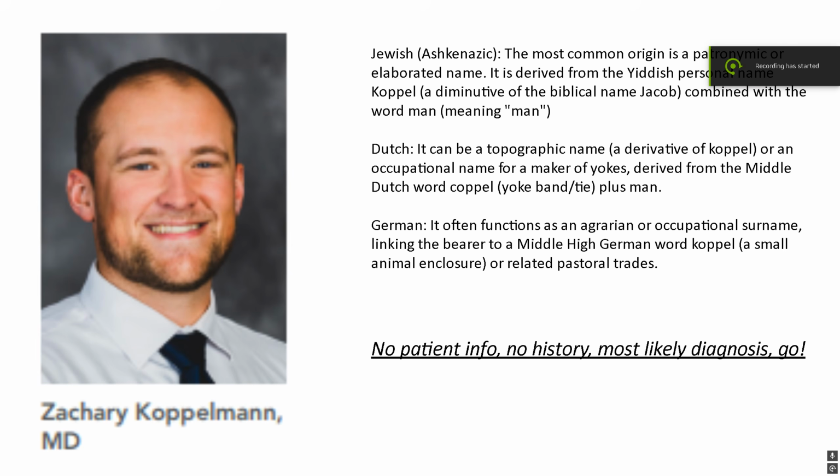I got a bunch of cases here. The theme of this video is texts I get from residents that have graduated. All of these cases are texts I got from residents graduated from Monroe, which were pretty interesting. Lots of good findings here, so let's share them.